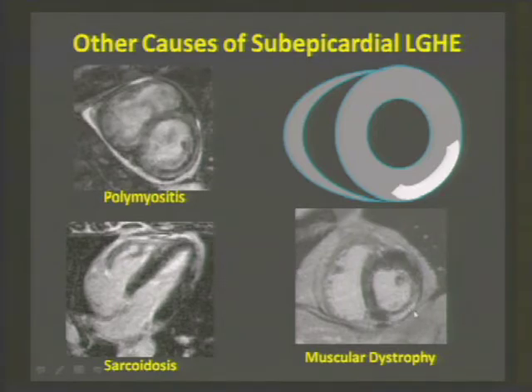This pattern of outward in is not a pattern that you would see with infarcts, even if this could be in the pattern in the vascular distribution of the circumflex artery. You should never see outer to in with infarcts or ischemic cardiomyopathy. In these kind of cases, the history is always known, so that's very helpful.